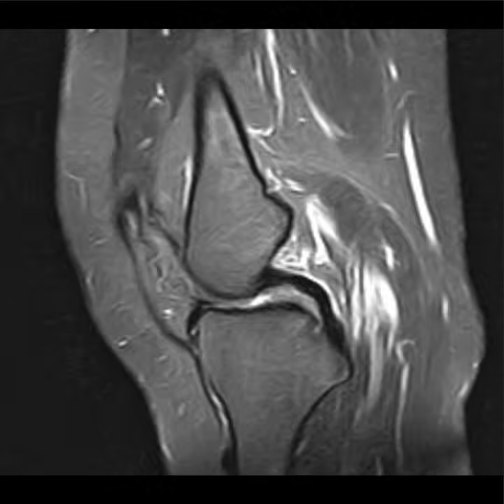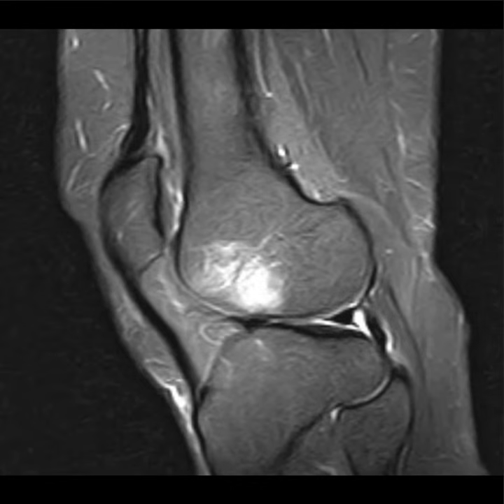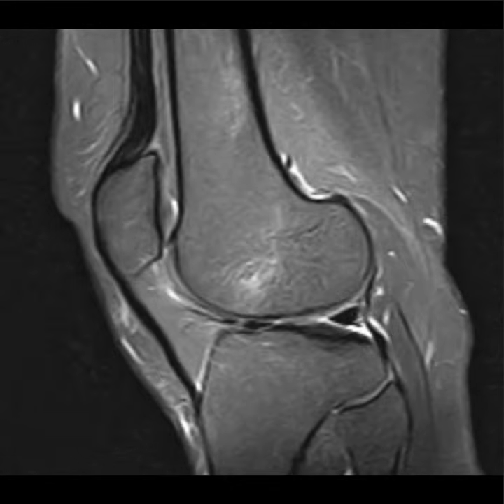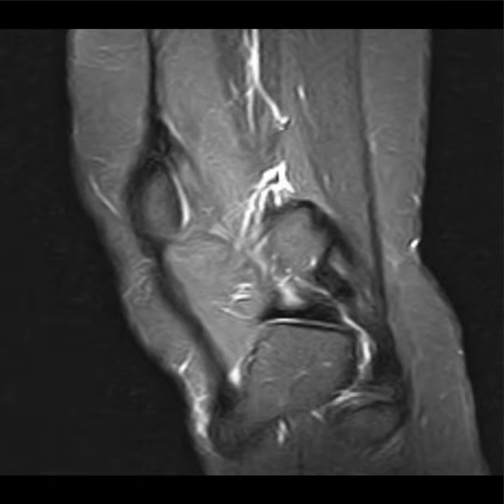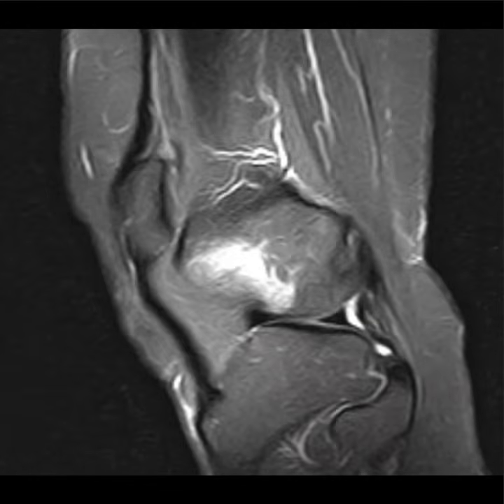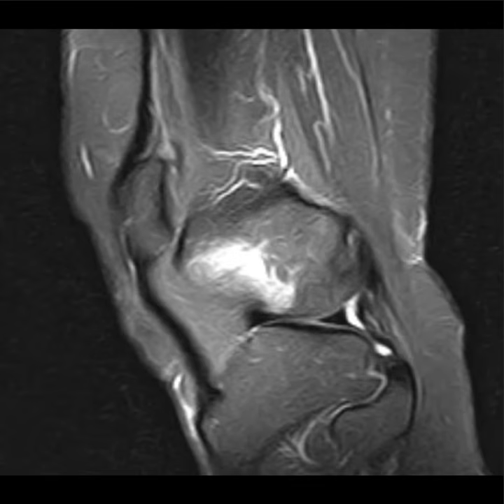These are T2 weighted fat saturated sagittal proton density images, and here I can clearly see an area of bone marrow edema at the anterior aspect of the lateral femoral condyle. How do you know this is the lateral femoral condyle? Well, obviously the fibula is here, and the fibula is on the lateral side, so this is the lateral femoral condyle.